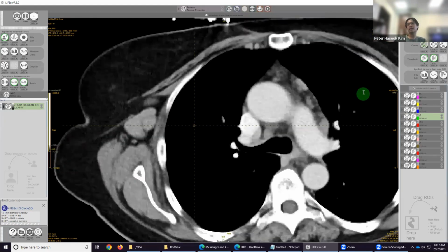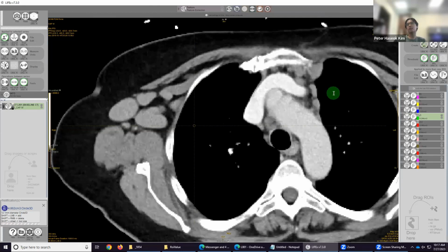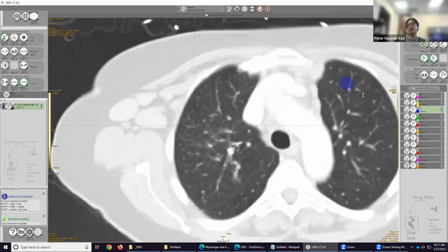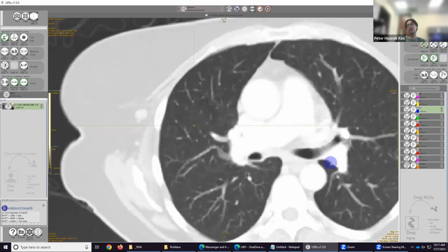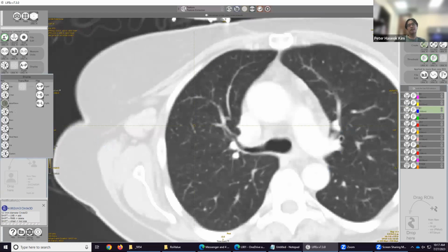And so for lung tissue, you just want to segment what visibly looks like healthy lung space from the chest view. If you go to lung view, you can see different vessels, or the bronchus, and all these different lines and things.